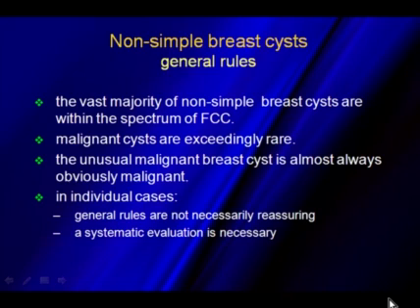General rules about non-simple breast cysts: the vast majority of non-simple breast cysts are within the spectrum of fibrocystic change. Malignant cysts are exceedingly rare, and usually if there is a malignant cyst, it's going to be obviously malignant. There will be features that you're going to notice that will say this is something that definitely needs to be biopsied.